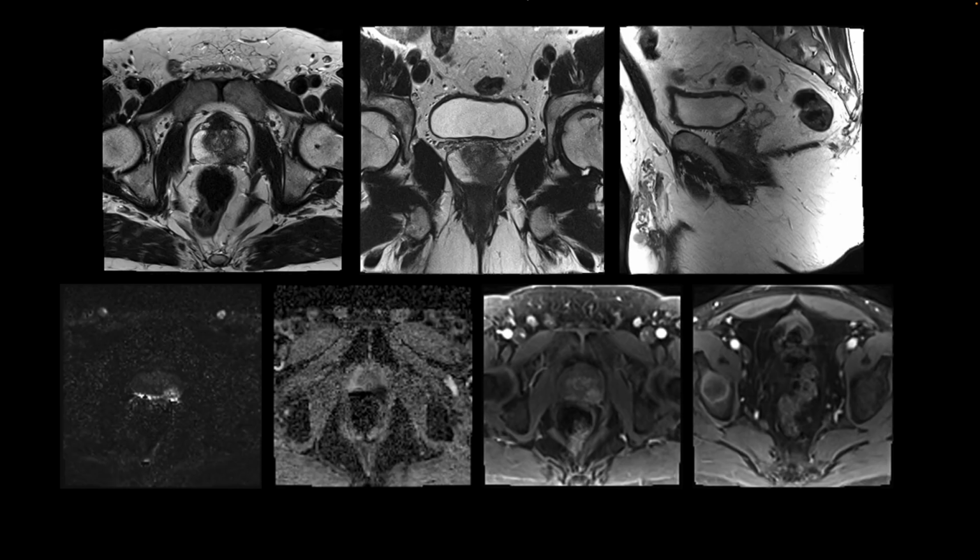This is our next patient, another MRI of the prostate for prostate cancer. The T2 weighted images in all three planes are on the top. That's our tumor in the left peripheral zone. Here is its appearance on the coronal image and the sagittal image. The tumor shows contrast enhancement. It shows restricted diffusion, high signal on DWI, low signal on ADC. And look at this focus right here.